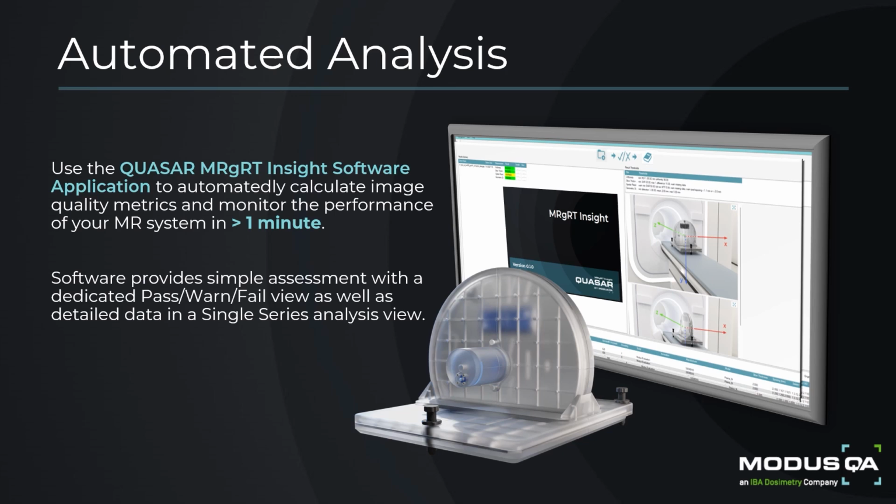However, if you want to deeply evaluate the statistics and really fully understand the limits of your MR system, further information about each metric is also provided with the detailed view of all the data. And that includes how it's calculated, all the uncertainties, and this is all going to be listed out in the single series analysis mode. There is also the option to complete all these analyses manually through the manual calculation view, where the software will then walk you through the process step by step. However, we can touch upon that in a little bit more detail during the software demonstration.